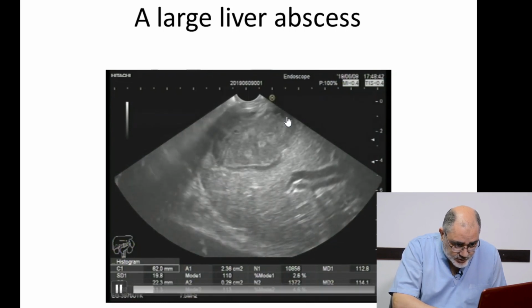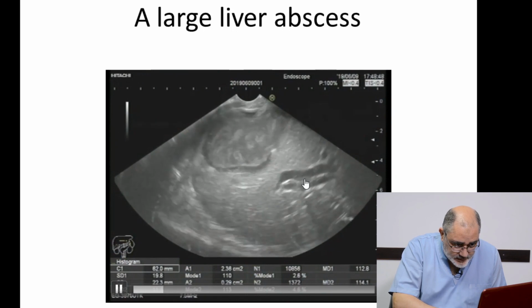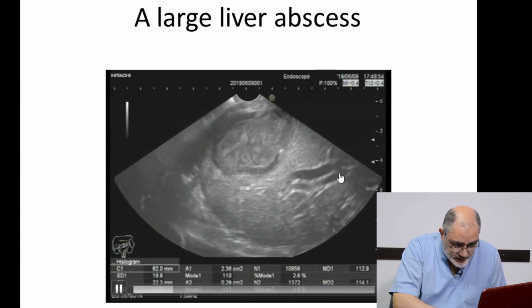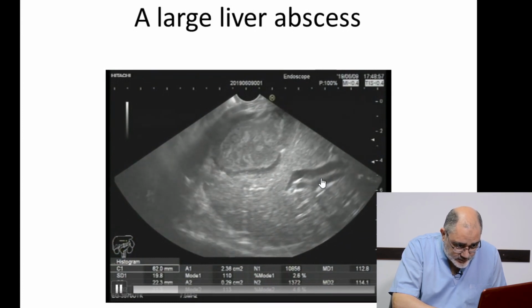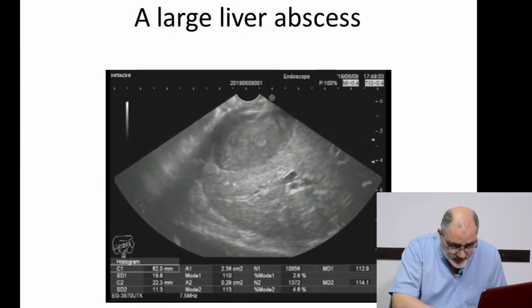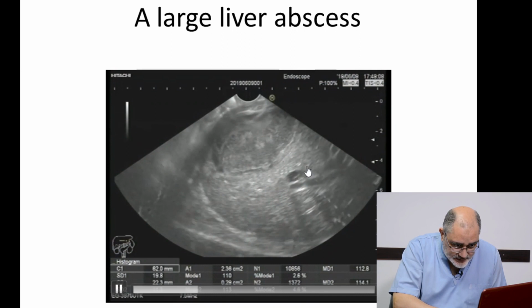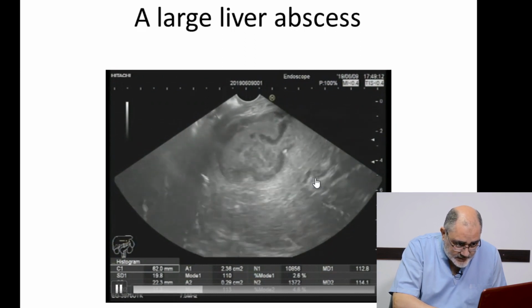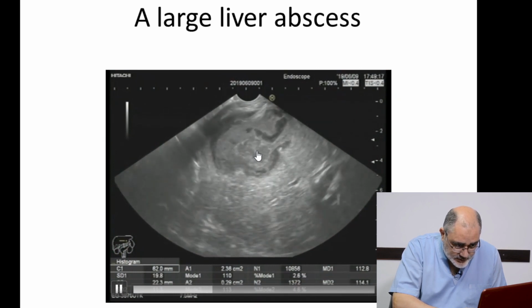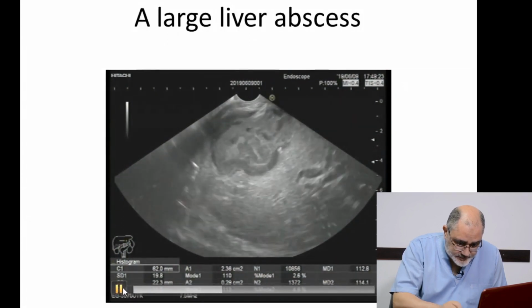Okay, and this is a large complex cystic lesion, and these two ducts parallel to each other: dilated biliary radicle and one of the portal veins, because they run parallel to each other. In normal, I can't see intrahepatic biliary radicles because they are slit-like or collapsed, but when there is obstructive jaundice, they dilate and give us this sign. And this is a large complex cyst inside the liver in the patient with obstructive jaundice with fever and rigor, so it is a large abscess.